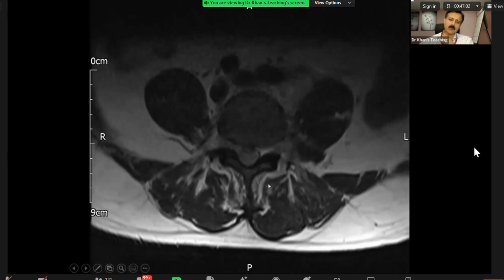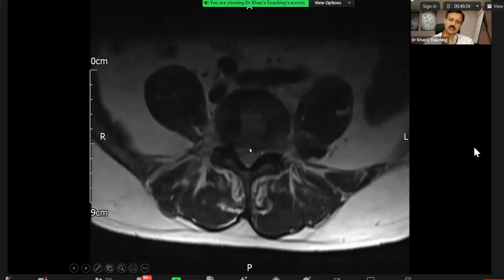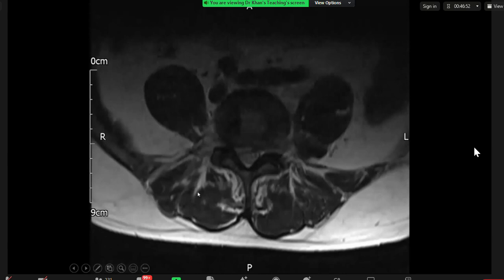I'm taking over the mouse. What is this, for example? Can you trace it? And next slide, please. Just stop here. Can you see something? Right? Yeah. So please continue to the next series.